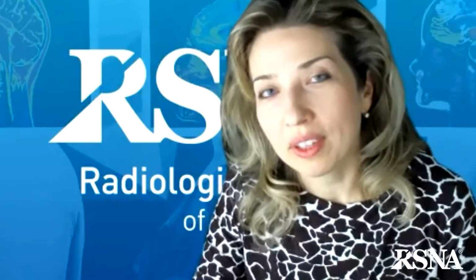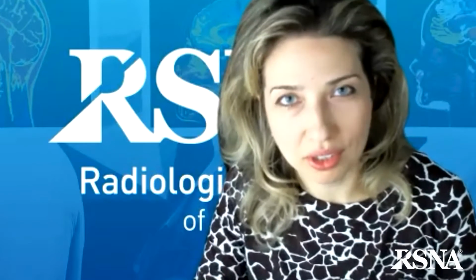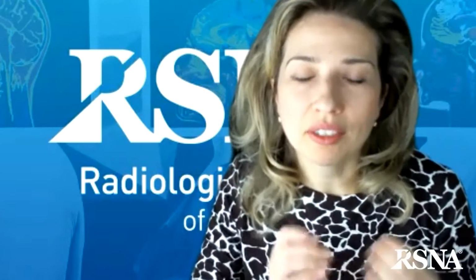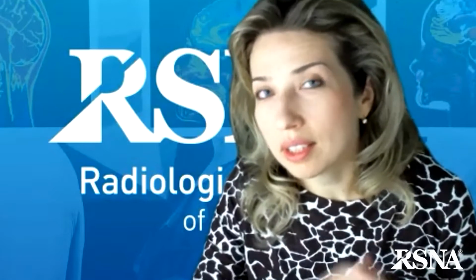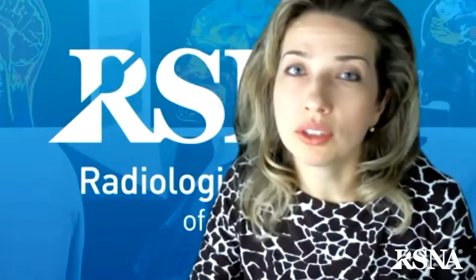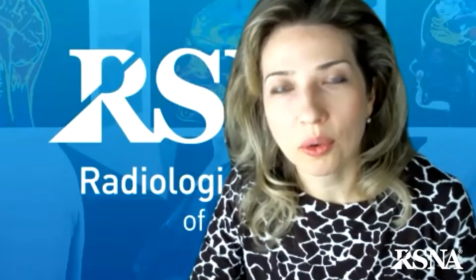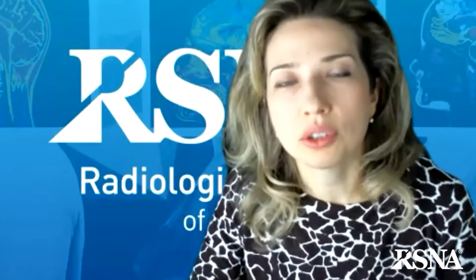However, it is the flexor tendon injuries that typically get advanced imaging, because MRI in these cases provides invaluable information for the treatment. And that's why these are the kinds of injuries we most commonly see on MRI: the flexor injuries, either open injuries, lacerations, or closed injuries. And of that group, the most common one is the so-called jersey finger, an avulsion of the flexor digitorum profundus.